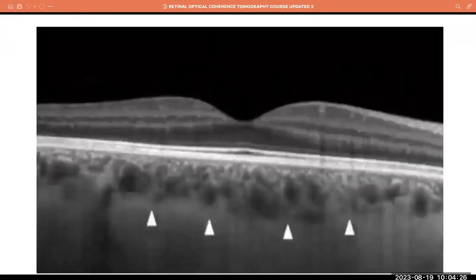On this one, for example, look at the nerve fiber layer thickness. This is for the right eye. The nerve fiber layer is represented on the left too, but it's not as thick, because the nerve fiber layer on the right is closer to the optic nerve, coming from the optic nerve, so the nerve fiber layer entering there is thicker. So this is the right eye.